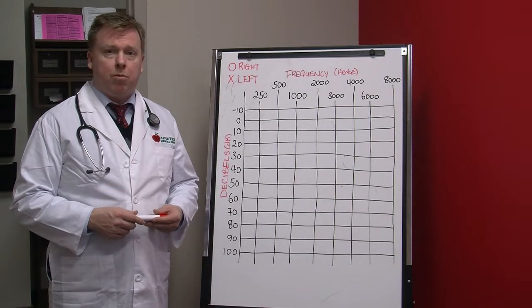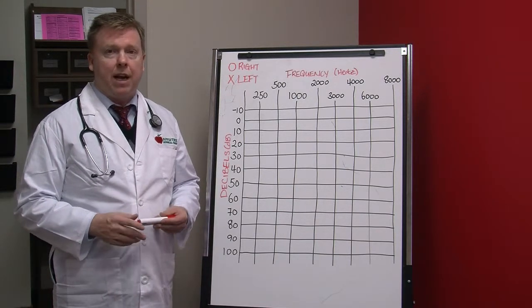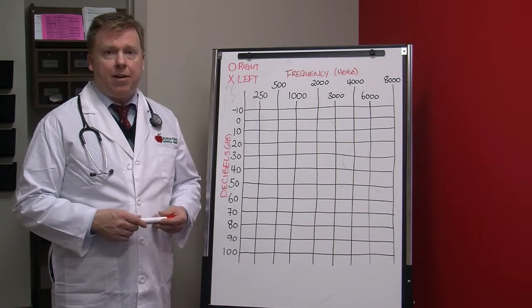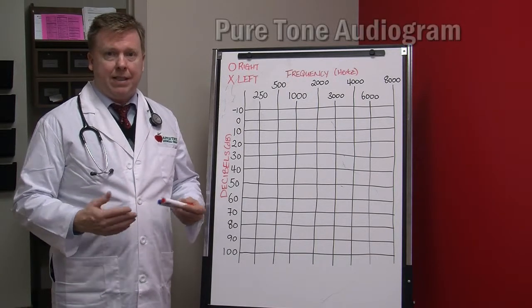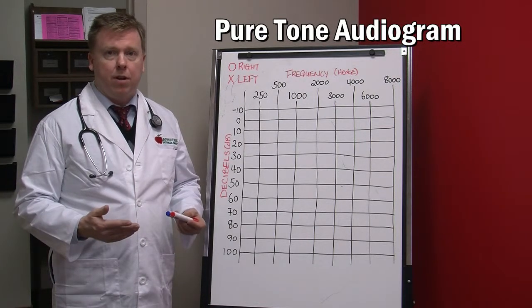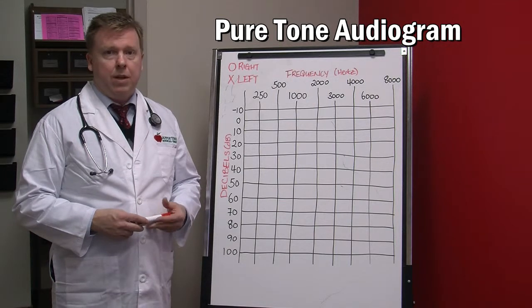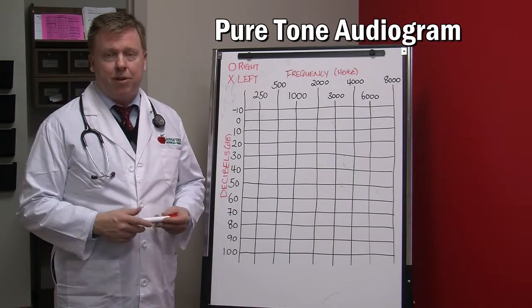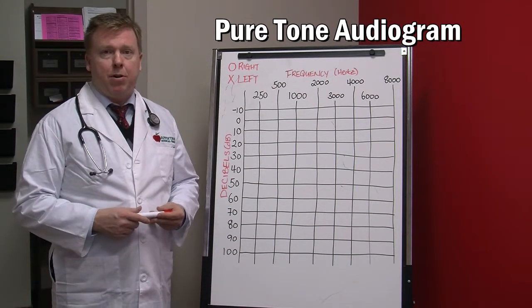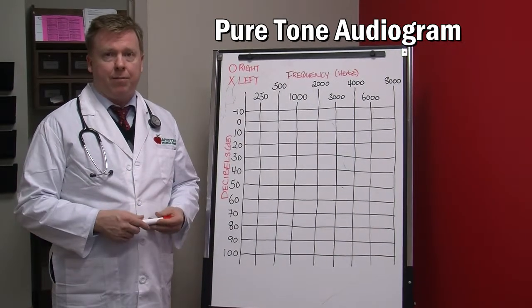So what we're going to cover in this short video is how to actually look at an audiogram and how to understand what it is telling us when a patient has done what's called a pure tone audiogram. Now, pure tone and hearing in general is going to introduce a lot of different terms. Pure tone reflects how we measure someone's hearing.